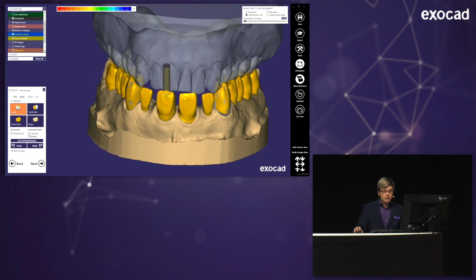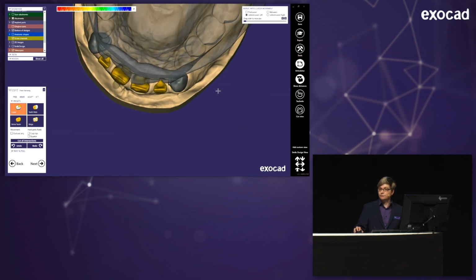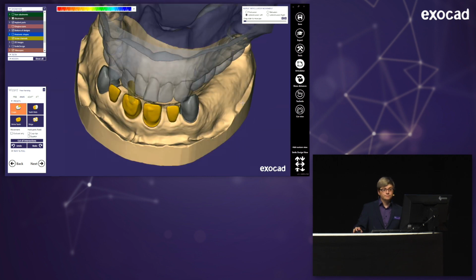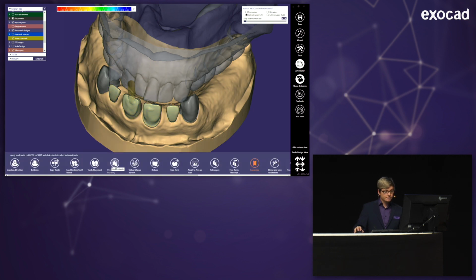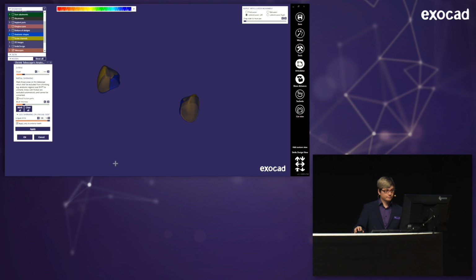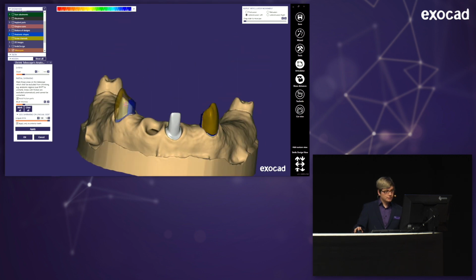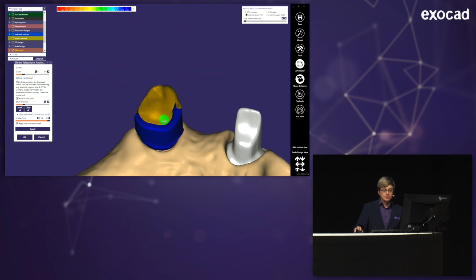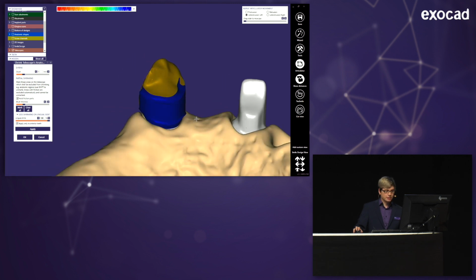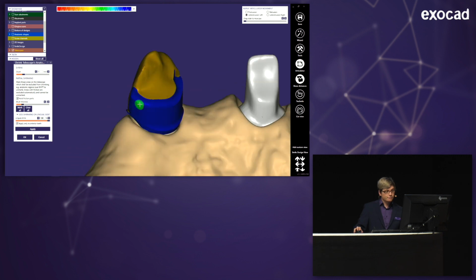And there's also the anatomical shapes of the telescopes, but not the telescopes themselves. They're grayed out. I can't freeform them now. But what I can do is switch to the expert mode. And now I have the option to choose shrink telescopic anatomy. So, and now you see 2 telescopic crowns, and the milled linguals are marked in blue. They're safe. They won't be shrunken if I press the button. And I can't even delete this color here, but I can add blue color here to make safe borders.